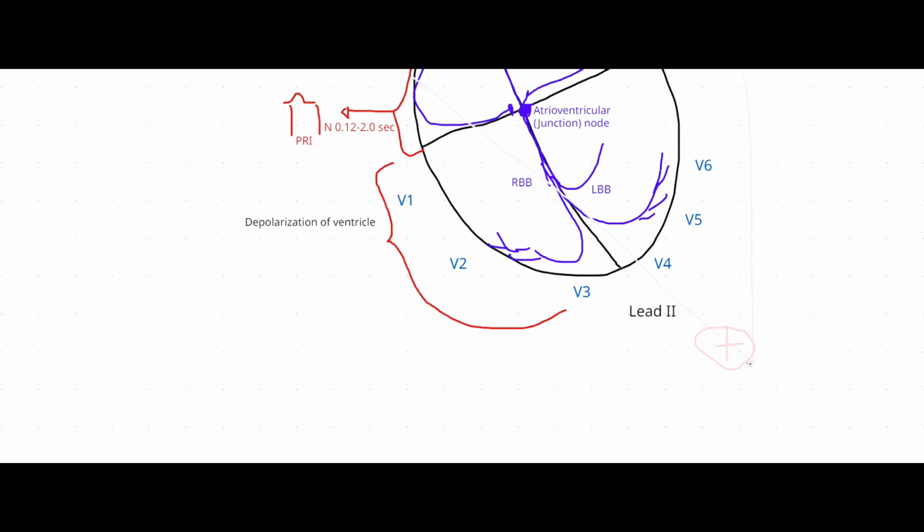We didn't talk about the T yet, but let me break it down for you guys. So the QRS complex is again from this here to when it returns to baseline. Okay, that's the QRS complex. Now, depending on where in the 12 lead we're looking at, it may be just an R, it may be just a QS, but we still call that the QRS complex, okay?